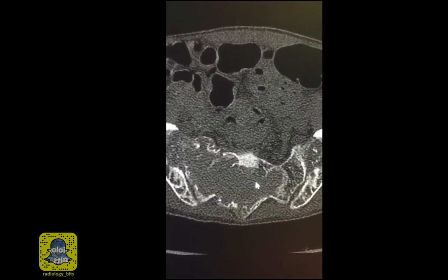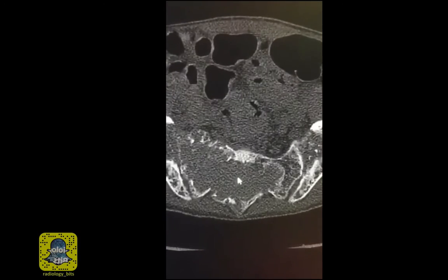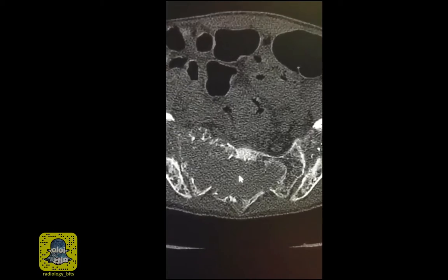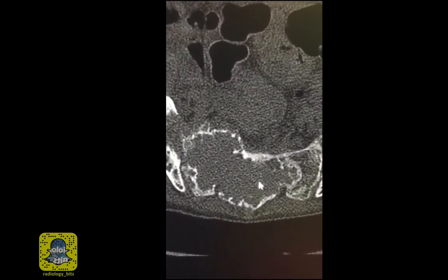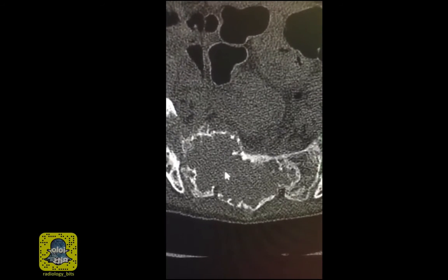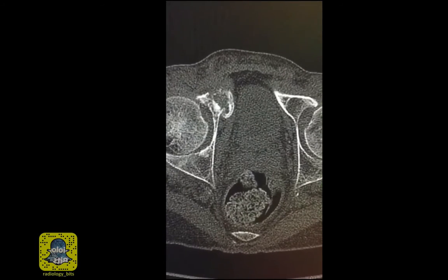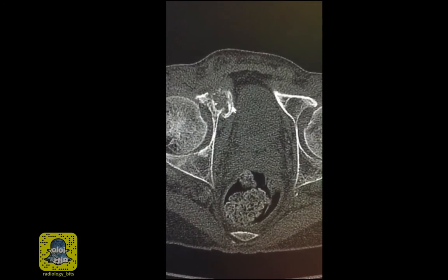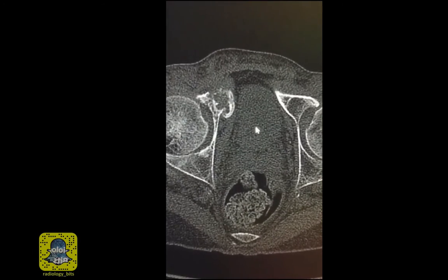It's not even a neoplasm, it's just a reparative process secondary to resorption and bleeding. You now understand why these tumors may have soft tissue components, cystic appearance, or even hemorrhagic components. Knowing that the bone is totally abnormal, this explains why the patient has fractures at multiple locations. These are all pathologic fractures, fractures of abnormal bone.